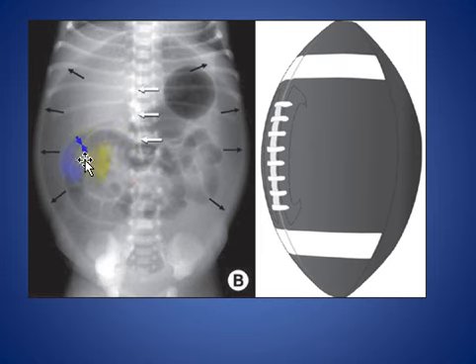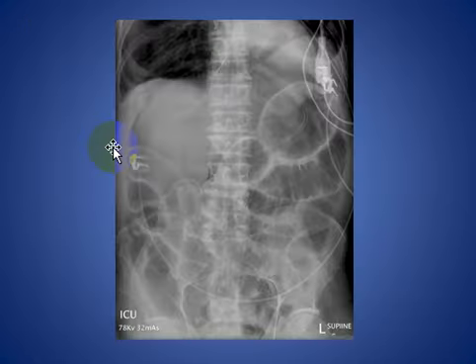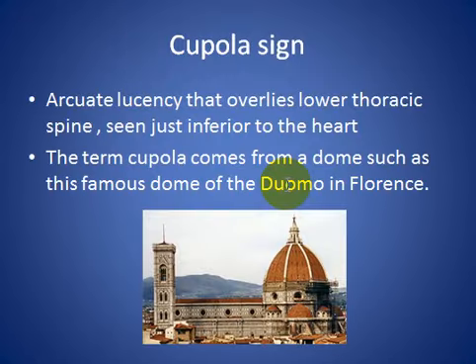As we see here also a Rigler sign outlining the bowel wall. This is a football sign in an adult with a Rigler sign also, as the wall is outlining between air inside and outside, and this is the football sign in an adult patient in supine film.